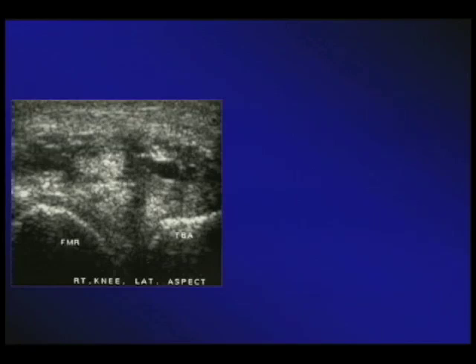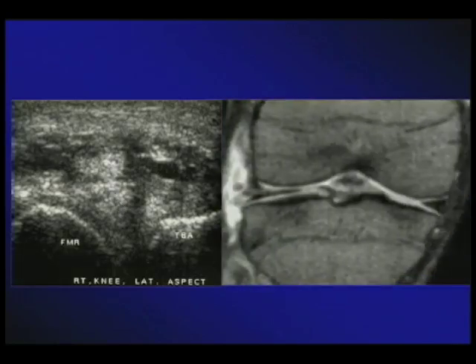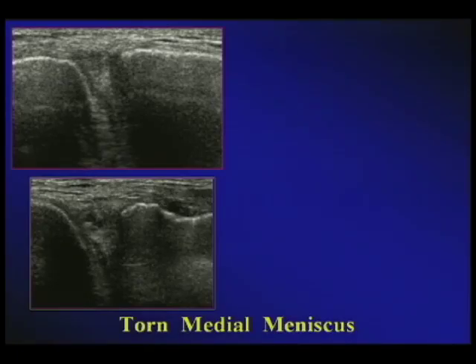It's not uncommon though, if you have too many triangles, that's too many menisci, then you know that this is a fragmented tear. But like we told you, it is always with MRI that we're going to confirm what's going on. But every hyperechoic fragment that you see on the ultrasound image on your left is represented by the same fragments on the MRI coronal T2 image on your right-hand side. Depending on the slice that you choose is where you might or might not see a meniscal tear.